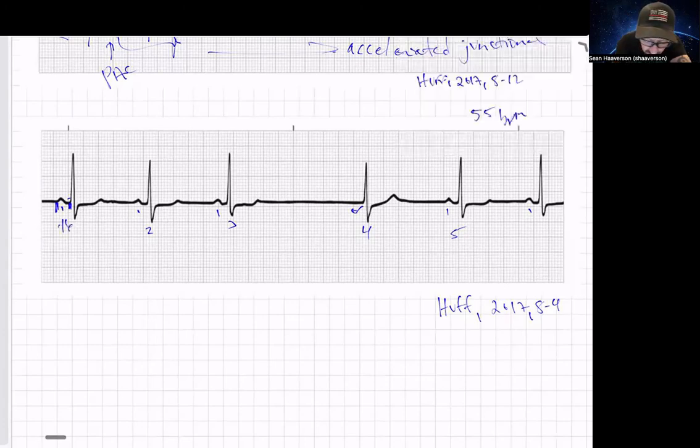Good. Our QRS complex is going to be from here to there. So that looks like it's about 0.12, 0.1 for our QRS. Let's see, there's the isoelectric line, so I'm not convinced that would look like depression to me. Otherwise, I think it looks pretty good. Let's see, we now have another P wave, looks like about the same beat. T wave, P wave, okay, R to R looks about right. And then we've got this long pause.